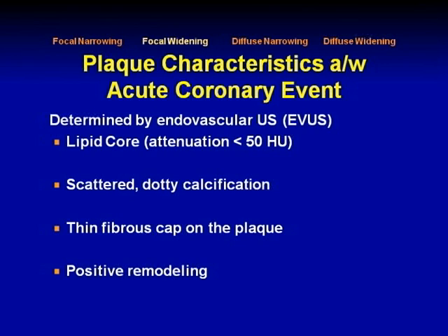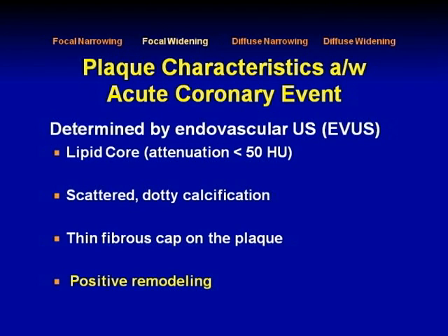Now I have to say, of all of these things, the lipid core, the scattered calcification, the thin fibrous cap, we don't have the temporal and spatial resolution to truly diagnose that and to confidently report that, despite what the software shows that it can do. The only one that we can confidently report is positive remodeling, and we do have the upper hand over coronary angiography in reporting that. So this is why it's of importance.